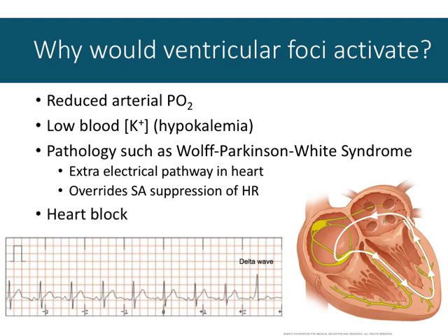Or if there's some blockage or delay at the AV node, then we allow the intrinsic depolarization of the ventricles to occur. If there's heart block, or if there's an artificial pacemaker, ventricular foci will activate because the pacemaker might send the signal for them to initiate or activate first.